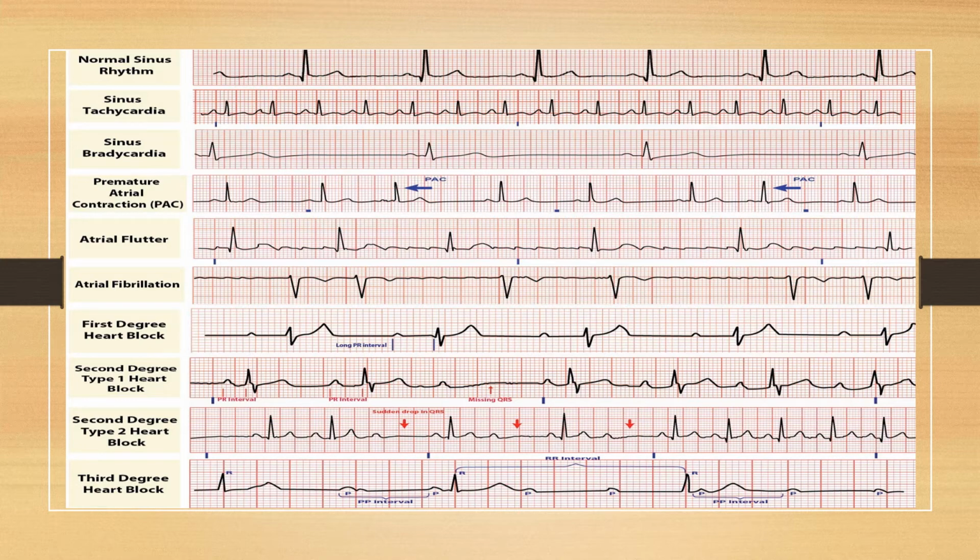There's no doubt. Okay, now ask yourself, how fast is it? So this one, 300, 150, 100, 75. It's 60 on the dot, of course, but let's just say it's just above 60, so 61. We'll call it normal sinus rhythm. Okay, the one below it.